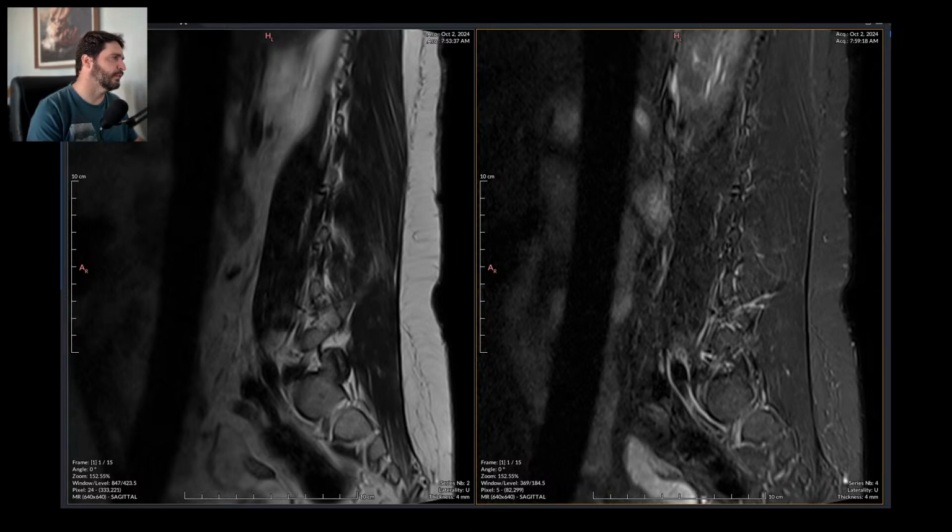No clinical history whatsoever, of course. It's just guesswork as always. The patient says she has arthrosis and her right leg hurts. This is it: right leg hurts, arthrosis, lumbar spine.